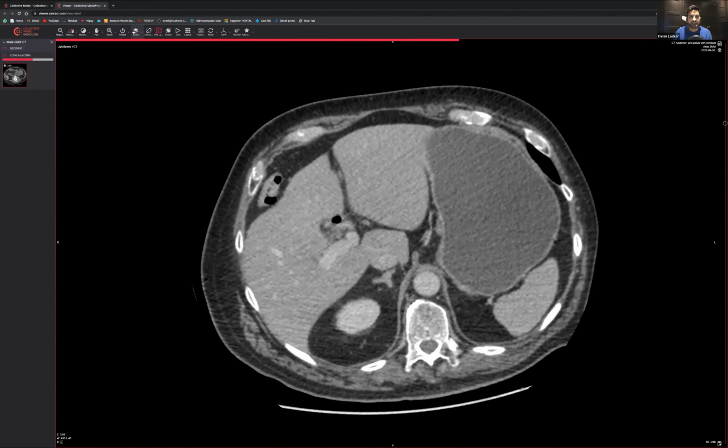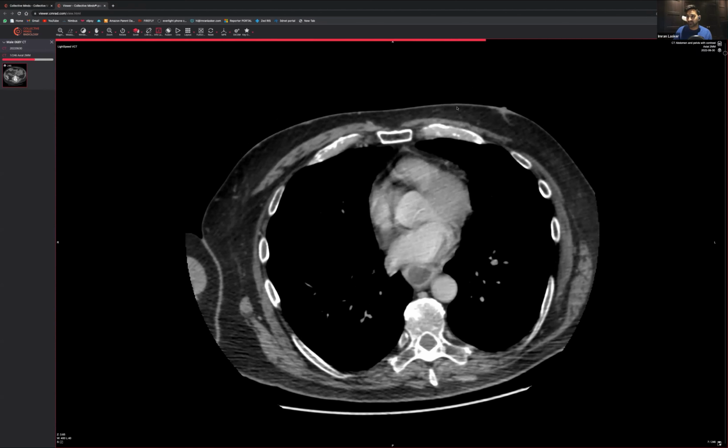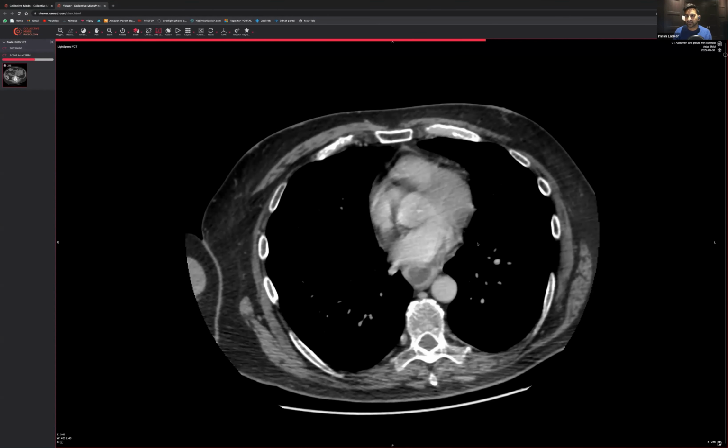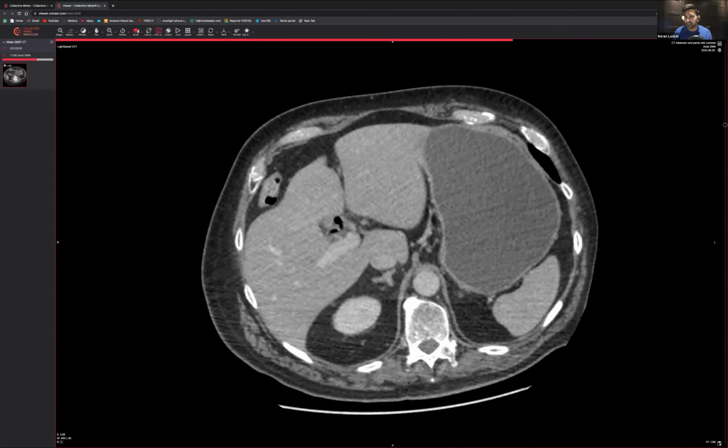As that comes across, we can start from the very top. Straight away, we can see that first off, this is a contrast enhanced study. There's contrast within there. Can you see the esophagus is sitting right over here? Now as you go down, we can see the esophagus looks a bit fluid filled. The stomach looks a little bit distended. That doesn't look quite right.